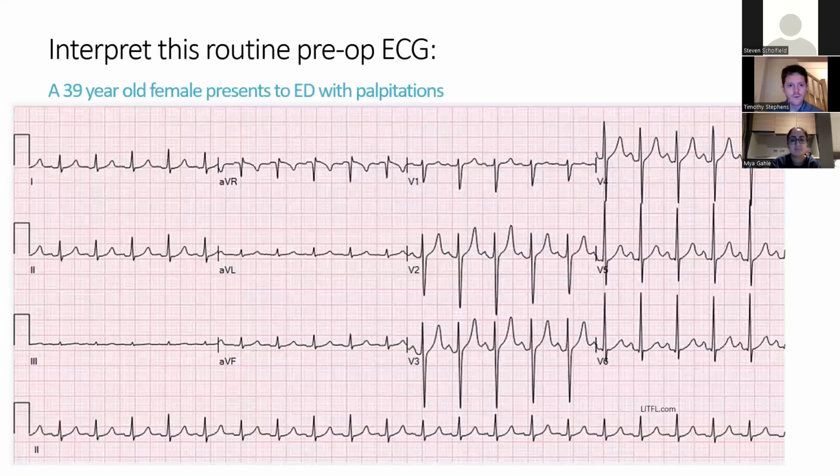Okay. So I have an ECG here. It's basically the simplest one of the night. So it'd be really good if somebody would like to have a go at telling me your process of interpreting an ECG. So you don't really want the diagnosis. I just want you to talk me through how you interpret an ECG. Does anyone want to have a go at that? I don't mind starting us off. Yeah, that'd be great. Talk me through.